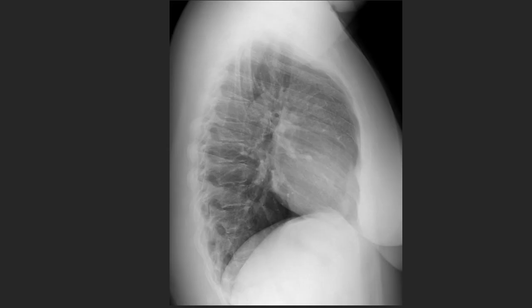So what forms cardiomediastinal contours on the lateral view? Let's start posteriorly. The most posterior and superior aspect of the heart on the lateral view, up here, is going to represent the left atrium. Remember, that's the most posterior and superior. The inferior and posterior aspect of the heart is going to be formed by the left ventricle, and sometimes you could actually see the IVC reflection going into the left ventricle. Anteriorly, we have our right ventricle. Remember, the right ventricle is going to be the most anterior structure in the heart, and it also gives rise to the right ventricular outflow tract, which you can partially see.